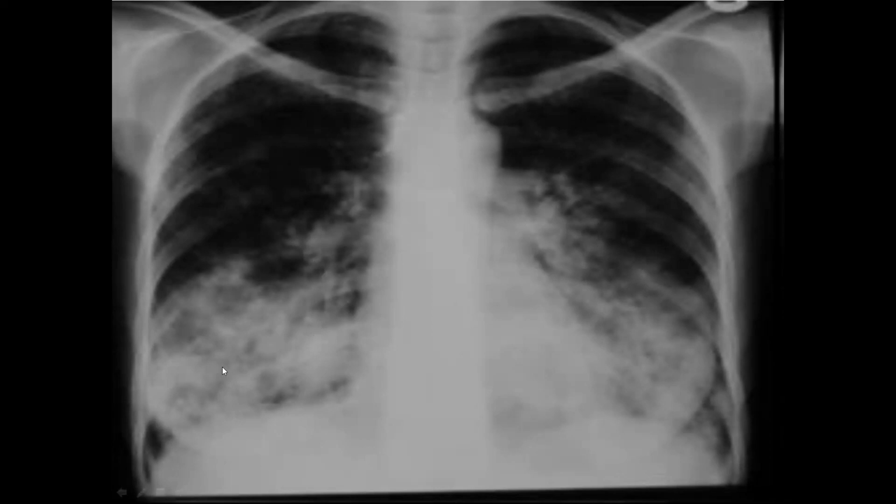Okay. Then one thing you need to know is pneumonia caused by Staphylococcus is quite common in children, and in those cases, you may be able to notice pneumatoceles. So, what are pneumatoceles? These are basically air-filled pockets, air-filled cavities that may be present more commonly in children. So, that's all about bronchopneumonia.